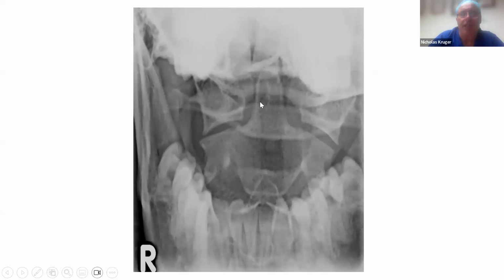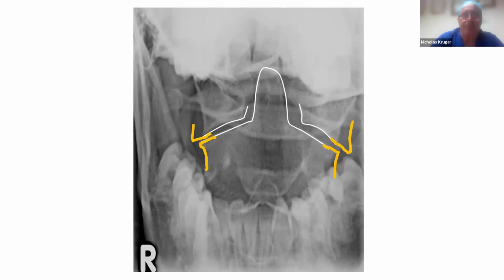So there's also the transverse ligament keeping the lateral masses attached to the peg. And if you have enough axial load, the C1 will blow apart, and you'll have this overlap. And if the combined overlap, if this distance there and that distance there, is more than 6.9 millimeters, then it means it's gone far enough to rupture the transverse ligament, and that's an unstable C1 or Jefferson fracture.